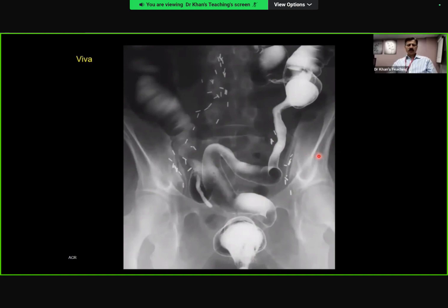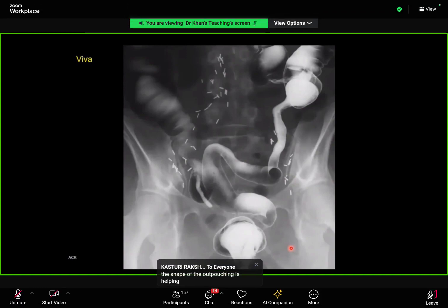This patient has had surgery beforehand, as you can see. Over to you, please. I've got a spot film from a double contrast enema, and I can see there's been previous surgery as well. The sigmoid colon appears to have a smaller caliber compared to the descending, and the rest of the bowel, the transverse and the ascending, is of normal caliber.